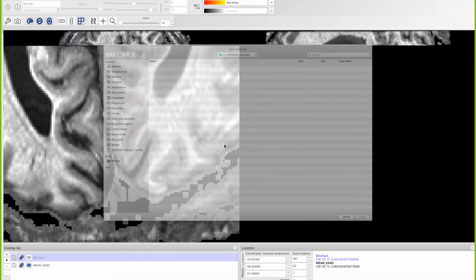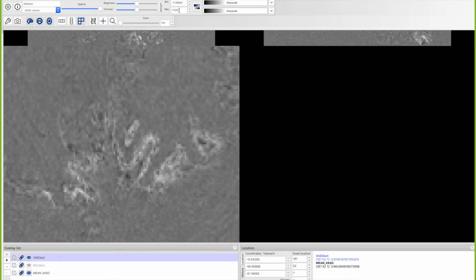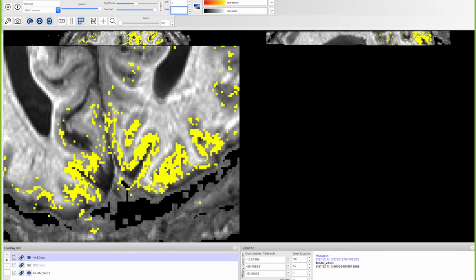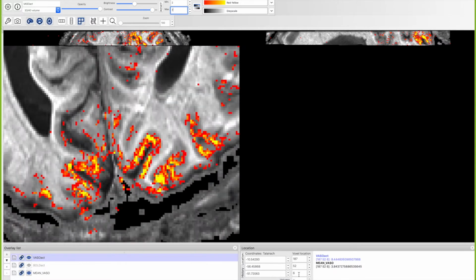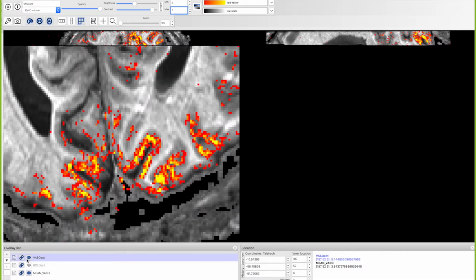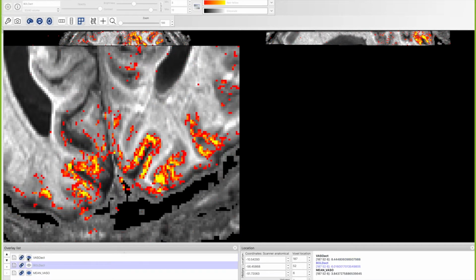As an example here, we also acquired a VASO, which we can use as a different contrast right now, or as a toy model of simulating different functional contrasts. It's just a bit noisier and has a slightly different activation pattern. It's not so much dominated by the superficial layers. It's more the deeper ones, and you can see that it mostly spares CSF as opposed to, for example, the BOLD, which is a bit more blobby, like there.